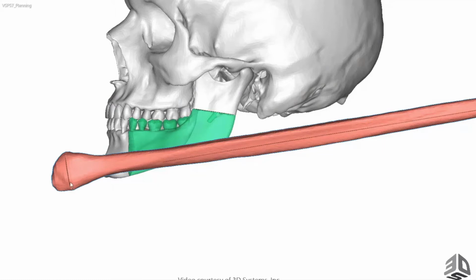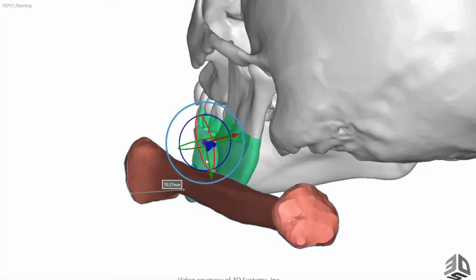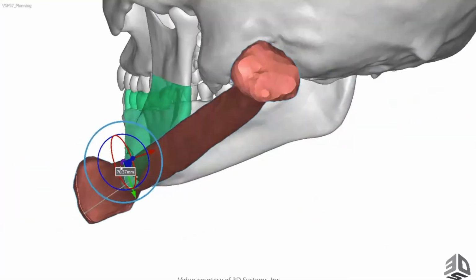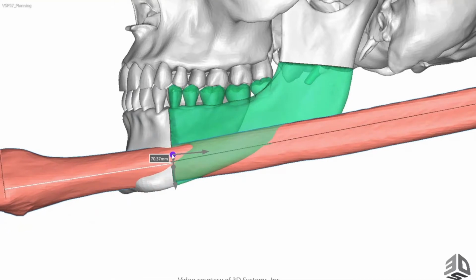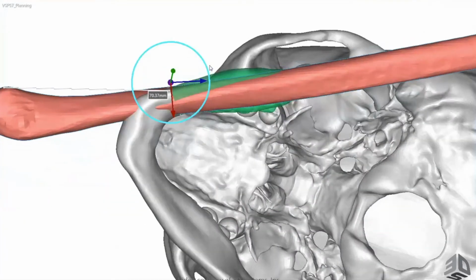And how high up off of that lateral malleolus should I start that first cut distally? So 7 to 8. 7 is reasonable. That's where most people will go. So if you can mark that out, please. Absolutely. So we'll start 7 centimeters from that distal lateral malleolus, and then I'm going to line that up. Is it okay to just follow the inferior border here? Yes, please, James. Perfect. And were you envisioning 2 fibula segments, one for the inferior border and then one for that posterior ramus? Yes, please. Okay.